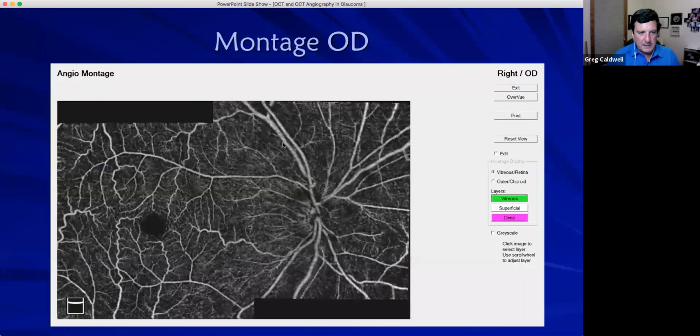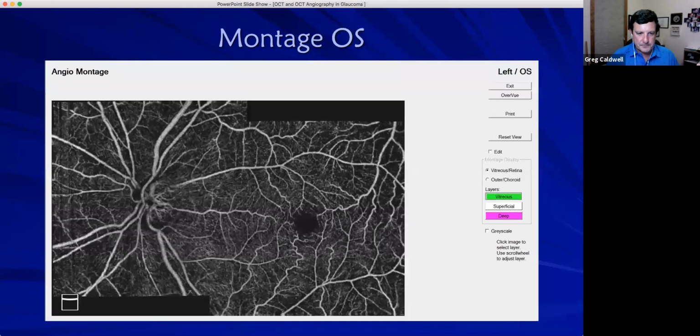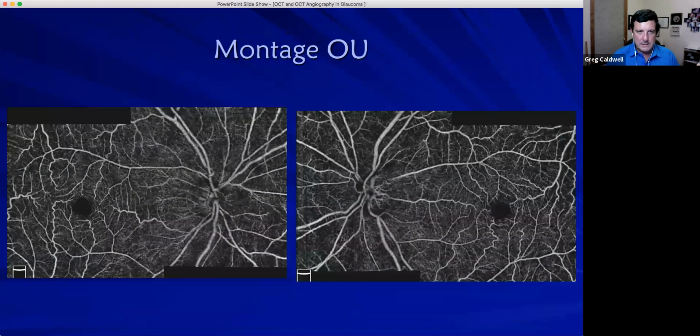And here they are just montaged, again, this is more to show off what the instruments can do. This is more information, maybe patient education. Not so great because there's really no numbers on here to be able to measure with these patients.